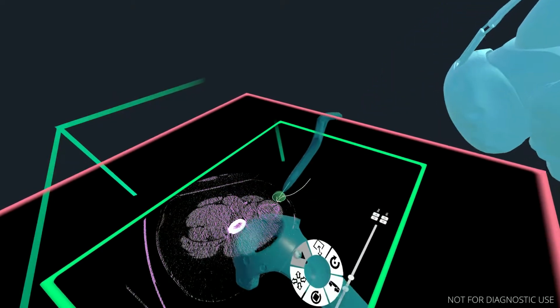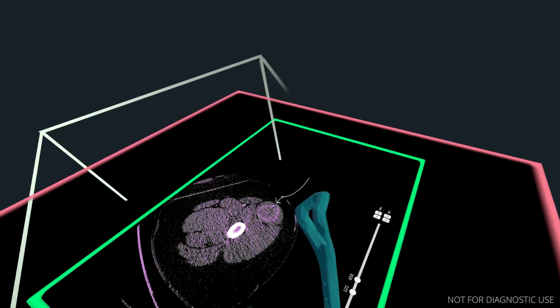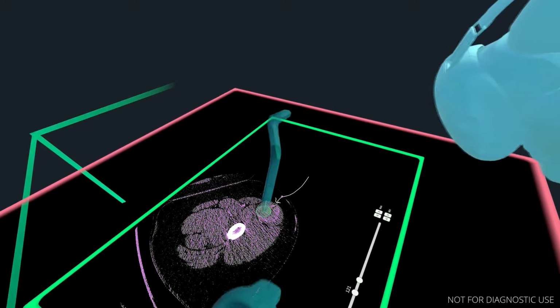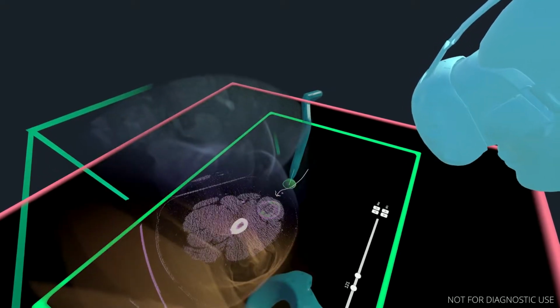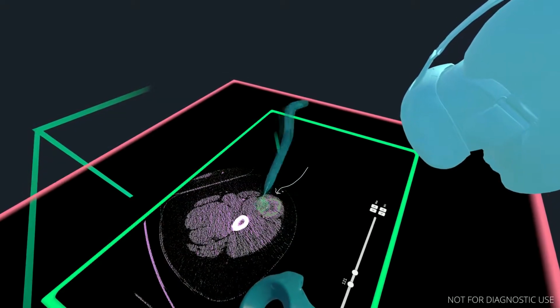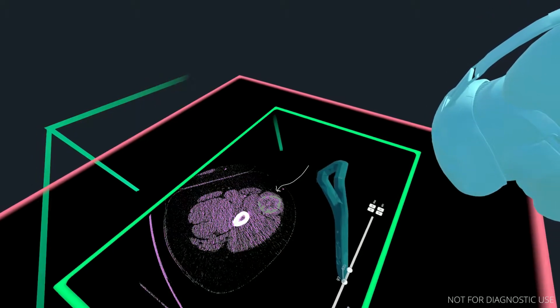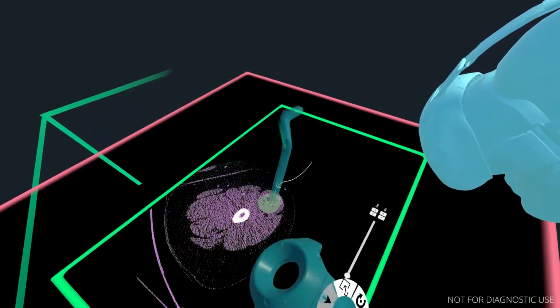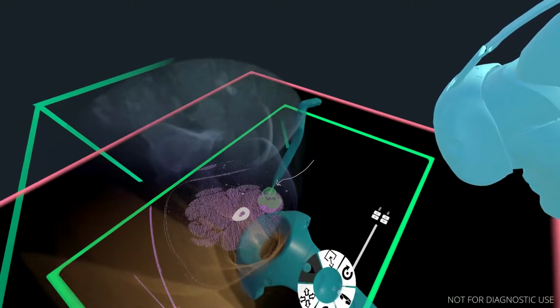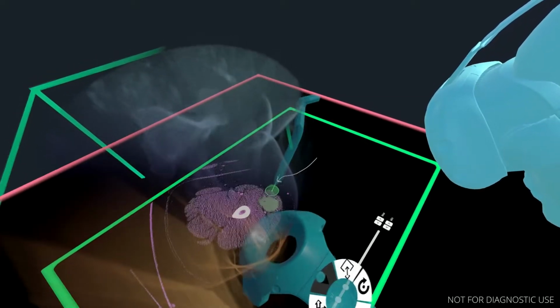So it's difficult because this image is noisy. And so what I'm going to do is turn on the reduce noise checkbox. And then as I draw, we should be able to see if it picked up enough of the underlying threshold. I think what I'll do is I'll be a bit more inclusive here and see if that made a difference. Yeah, it did. So that finds the edges fairly well here, just because I've turned on reduce noise in the model creation step.